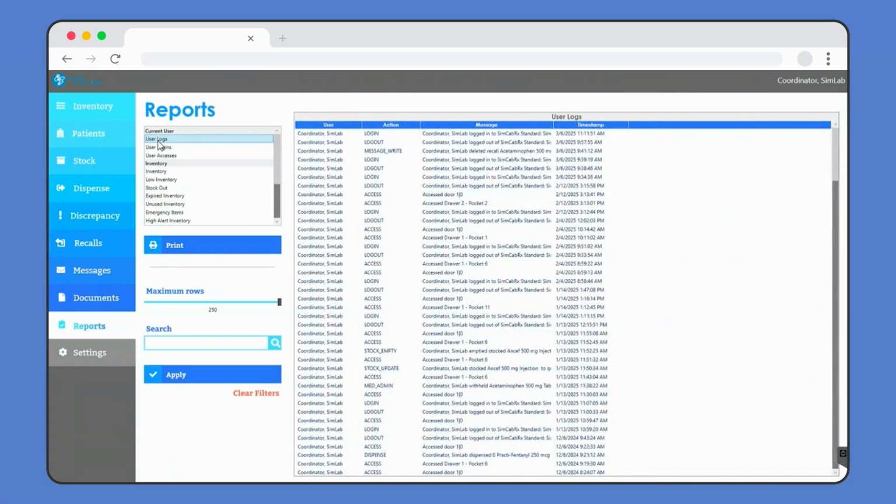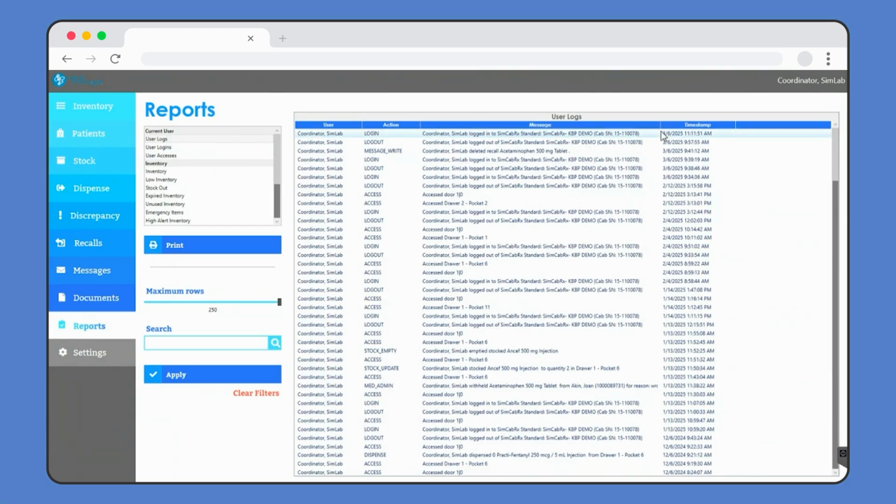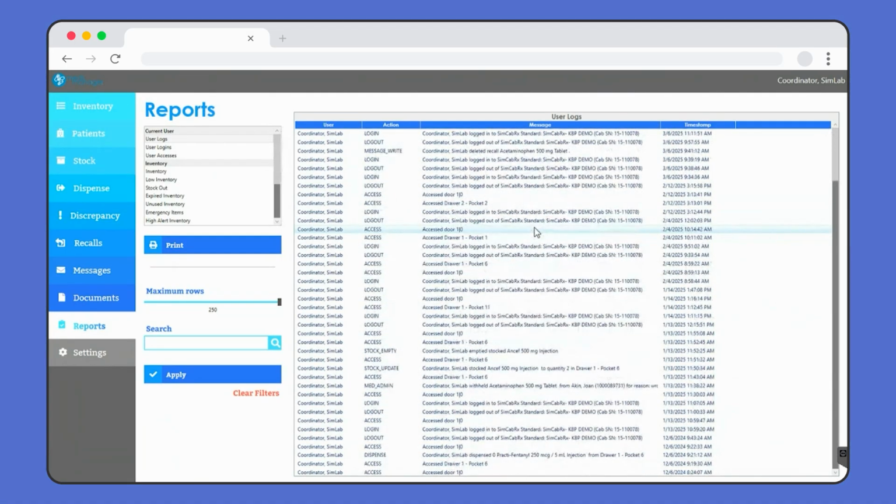When the system processes, it creates a timestamped and dated log file of all activity that has occurred in MedsManager at the specific medication device. So in this case, I'm working at my SimCavRx. You'll see a timestamped and dated log file of everything that has occurred. This list will roll off after 100 uses, but always the most up-to-date information will be at the top of the screen. Just giving guidance into the students' practicing pathway.